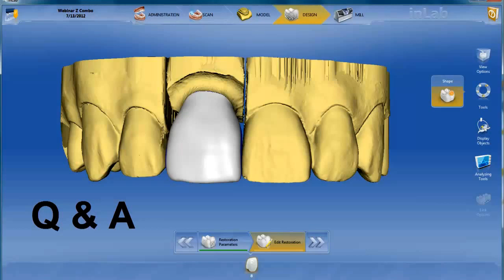And then I'll do my opposing and my bite, simply because while I'm scanning in the opposing model and the buccal bite, the computer's working on correlating the models together, stitching them and getting them in the right place. So it's kind of an efficiency thing with me, that I just like to get it all done as quickly as possible and let the computer do its thing in the background if it can.